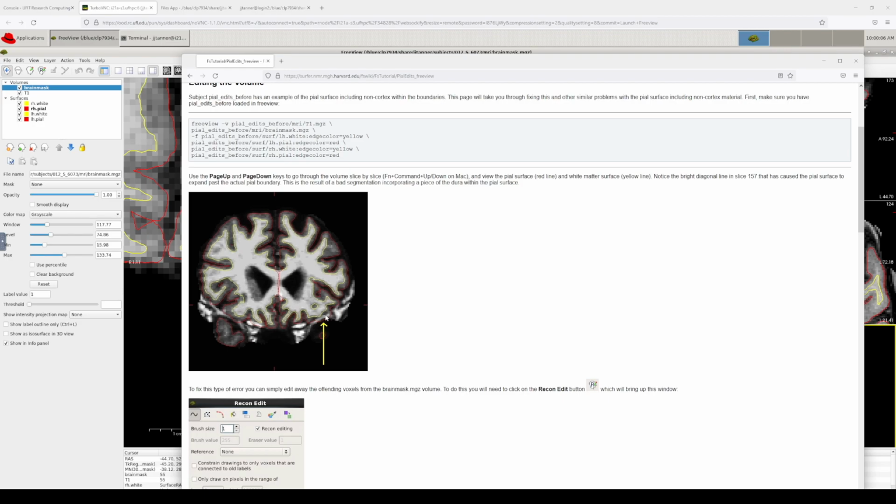But if we're talking 200 brains or more, which is closer to the sample sizes I'm using now, it's just really not feasible from a time standpoint. And so again, that's a trade-off. It's a decision. Maybe it is really important, and so you need to go through and clean it up. But then you also want to hope that you're consistent everywhere, meaning if you're finding that error, are you finding the little errors over there as well and cleaning those up?